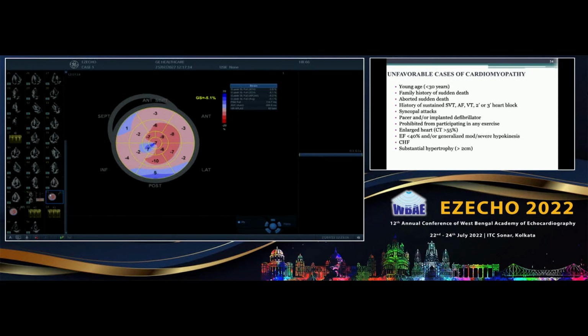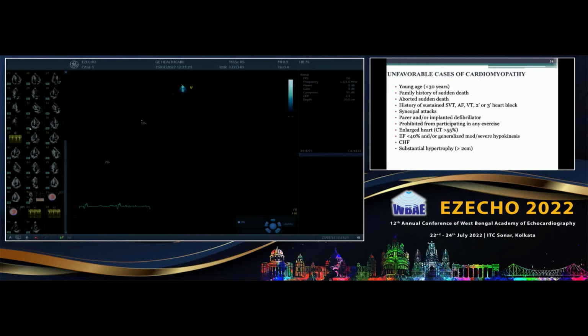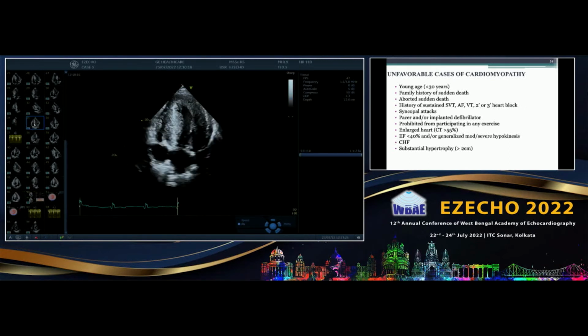So anyway, this is finished. Any question about the hypertrophic cardiomyopathy from the audience? Then we'll go to the next, ischemic heart disease. You also have to tell the filling pressures and E by E prime. Yeah, please.